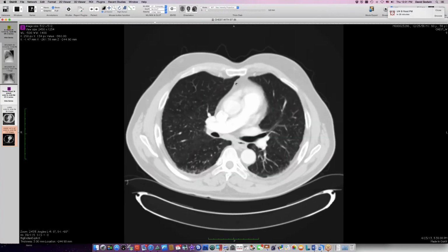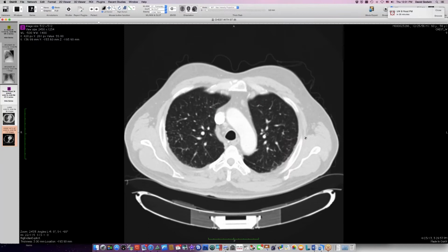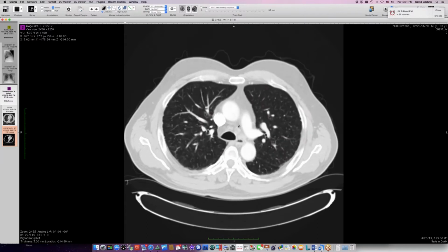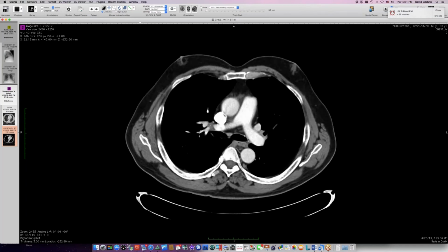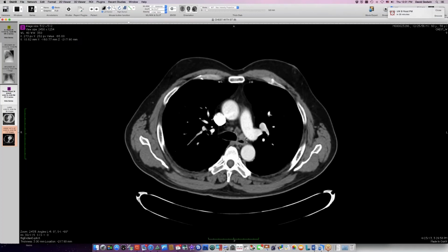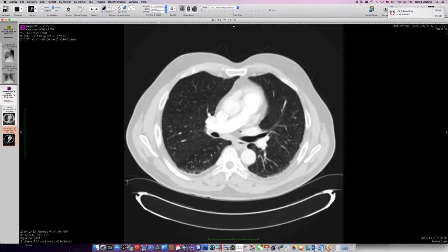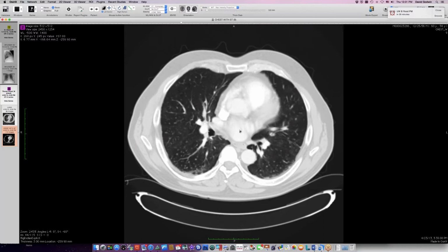So I think we have coal workers pneumoconiosis here, with nice attempts at pseudoplaque even out here with this peripheral distribution of these granulomatous lesions from his coal dust. And some of the lymphadenopathy in his mediastinum lit up on a PET CT from outside, which I'm not showing today. So I'm not sure whether these were part of his coal workers pneumoconiosis/silicosis, or whether that was part of his lymphoma. I think the only lymphoma that they were confident of was in the abdomen. So more than one disease here, in this case coal workers pneumoconiosis, along with his abdominal lymphoma.